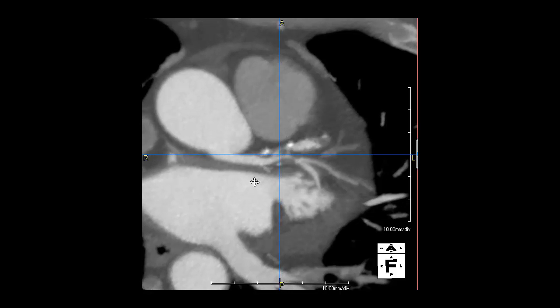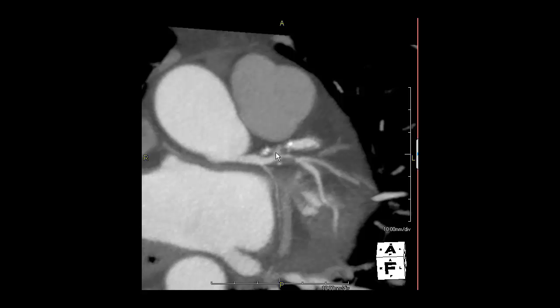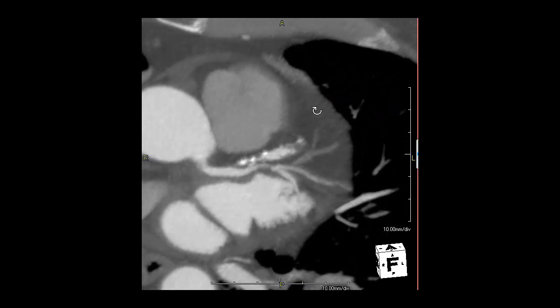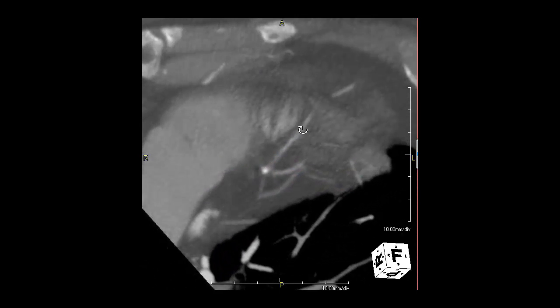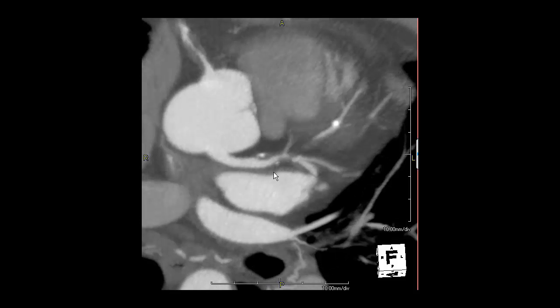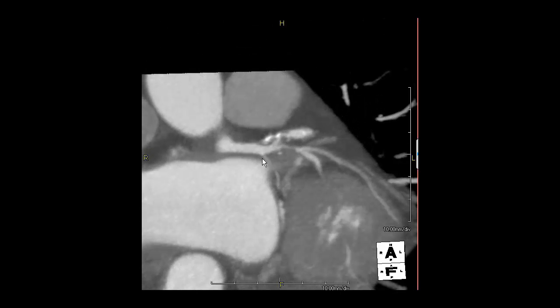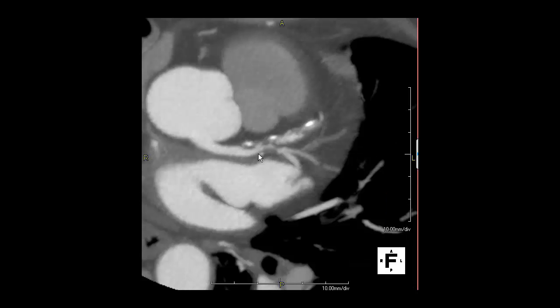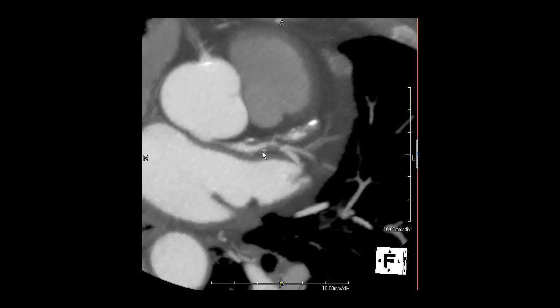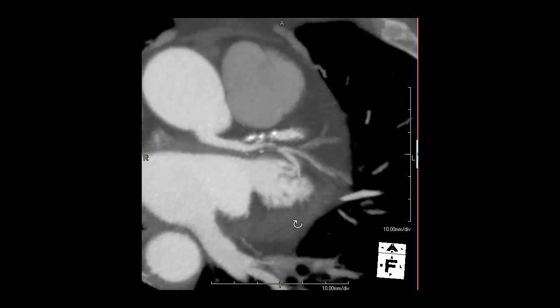We next examine the left anterior descending, where there is found to be significant and severe disease in the proximal and mid segments with mixed calcified, non-calcified, and clearly obstructive lesions. The distal or apical LAD appears to be relatively normal. Back to the left circumflex, again, there's a very small left circumflex. However, there is also a takeoff of what might be considered a ramus intermedius, which proceeds down in the distribution of an obtuse marginal, but has in its origin or in the proximal segment very significant and obstructive mixed plaque using calcified as well as non-calcified and clearly obstructive.